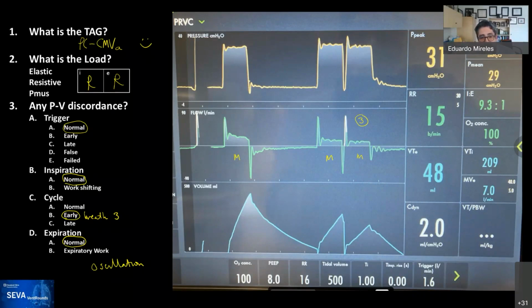And actually, this recoil or this movement up and down of the pressure that occurs, you can see it much better on this side, but it occurred right here too, and here. But you can see that in this one, it didn't cross the zero baseline and it didn't trigger the breath, but it did do that on this one. So creating a false trigger because of the speed at which it's trying to control the pressure.